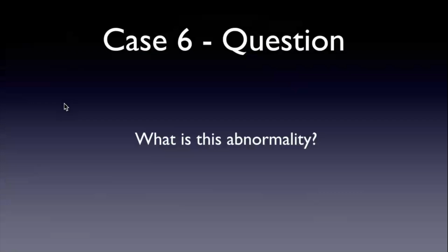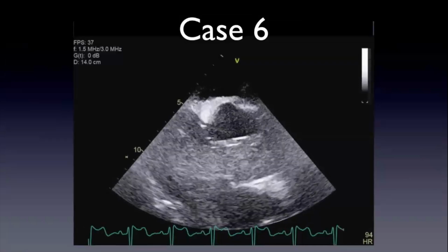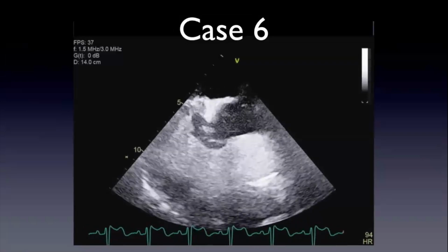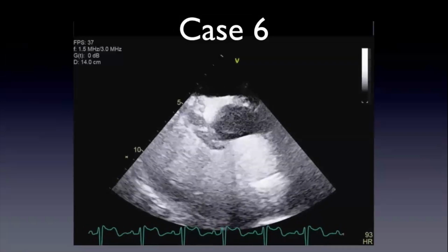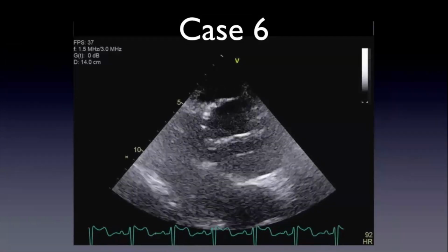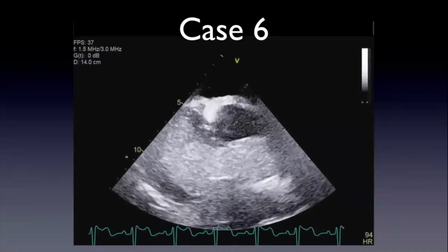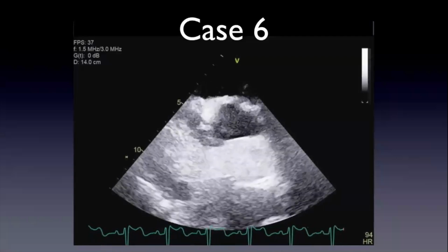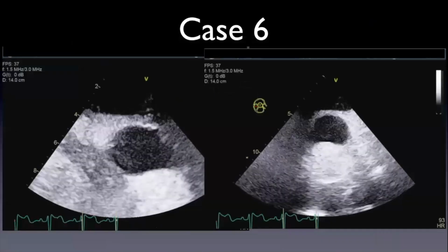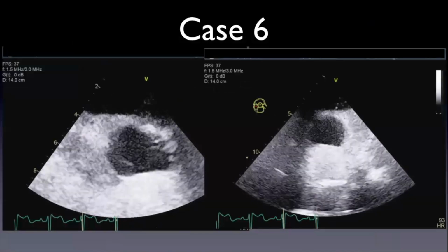So contrast. Good answer. That's always the correct answer for these ones. Contrast. What the heck? So there's no contrast opacification, right? There's no connection of this structure to the blood pool. We do it on multiple views. A nice big first pass. And here's a thing. Zoom through here. Not bad, eh? What the heck?